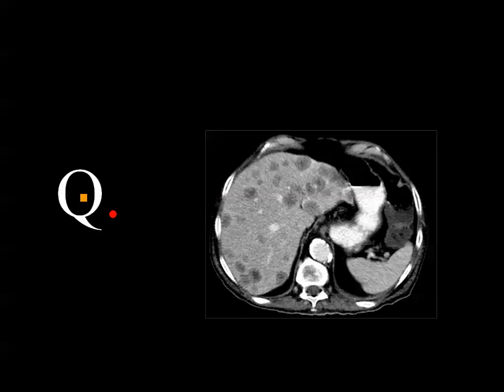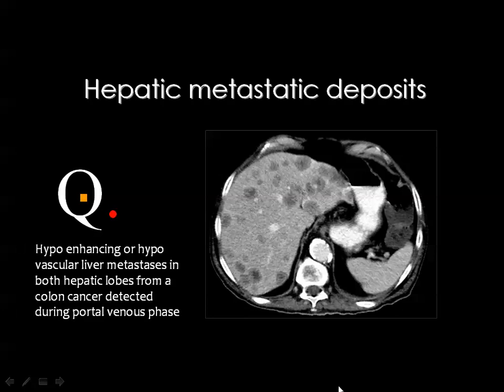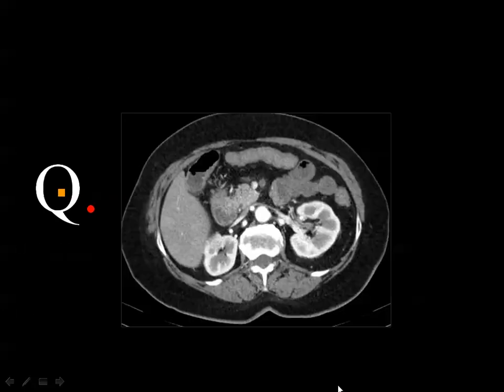Then if the liver is cirrhotic, they think more of hepatocellular carcinoma. If you see focal lesions in the spleen, then you think of lymphoma. If you have a known primary malignancy, then you think of metastasis. If not, look at the surface of the liver. If the liver is not cirrhotic, you can exclude the possibility of multifocal HCC. Then you think of metastasis and lymphoma, both can have the same appearances.